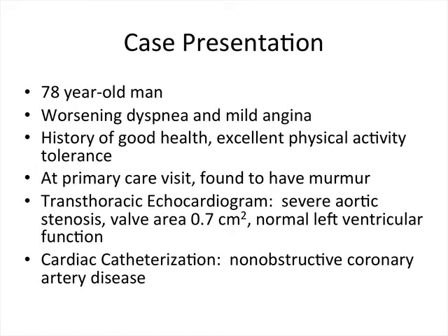As you may remember from our October 2011 podcast, we reviewed the pathophysiology of aortic stenosis and the basic TEE views used in the operating room to look at the aortic valve. In Part 2 this month, we will discuss the quantitative evaluation of aortic stenosis with TEE.